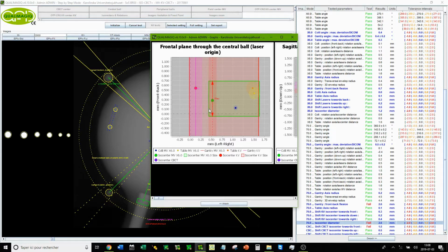When the flex is taken into consideration, the size of the isocenter is increased in the head-foot direction. You can see that we are above the collimator tube and the couch tube. You see that we have centered the flex on the isocenter. Why? Because the flex was determined by the movement of the cross-test object in head-foot direction, and you do not treat with the cross-test object, you treat with beams. So we are able to determine the amplitude of the flex, but we are not able to position it in space.